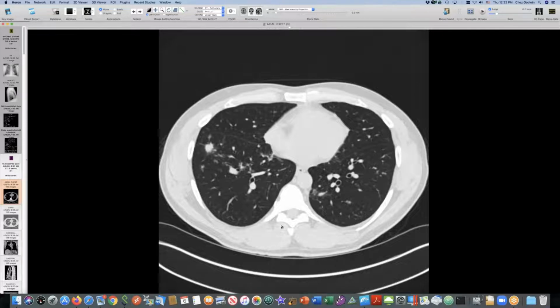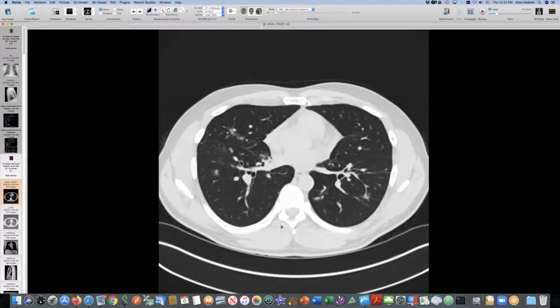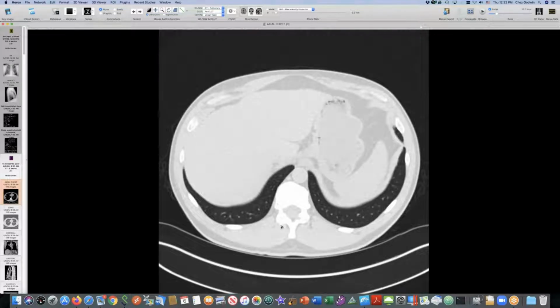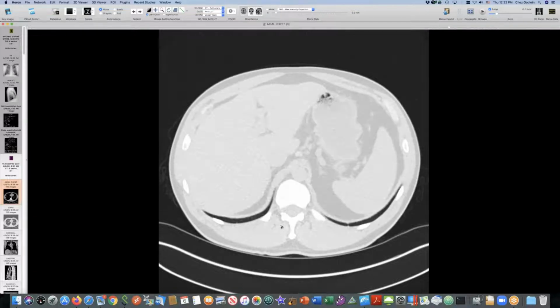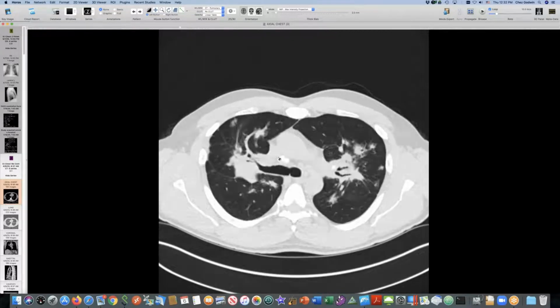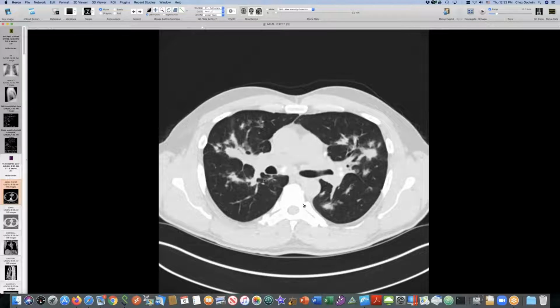So there was a big debate about whether this was sarcoid or silica, and there were biopsies, and there was refractile material in the biopsies. There were granulomas. I don't remember exactly what they biopsied, but there were granulomas, and there was polarizable material that corresponds to dust. So this is probably silicosis rather than sarcoid, despite the very nice galaxy signs up here. And for me, this finding of high attenuation subpleural stuff and calcified nodes or mineral containing nodes along the esophagus is a sign that this is probably silicosis and not sarcoid. In this case, we have biopsy proof.